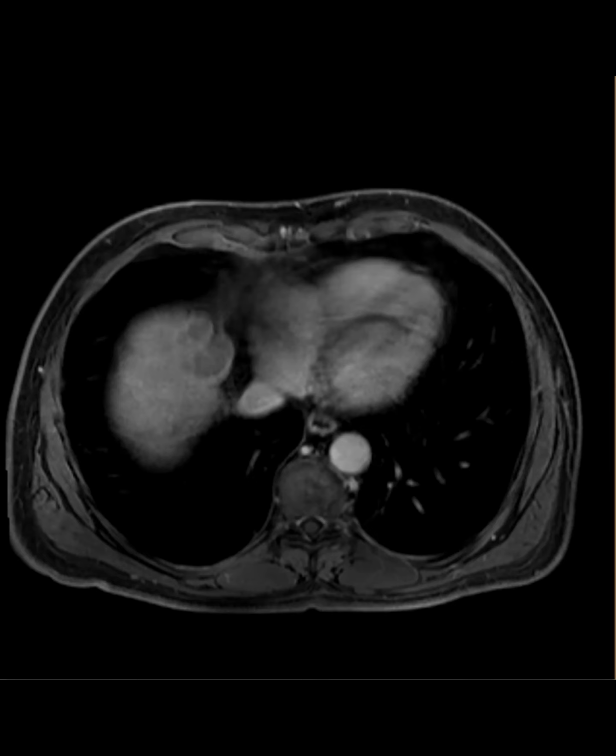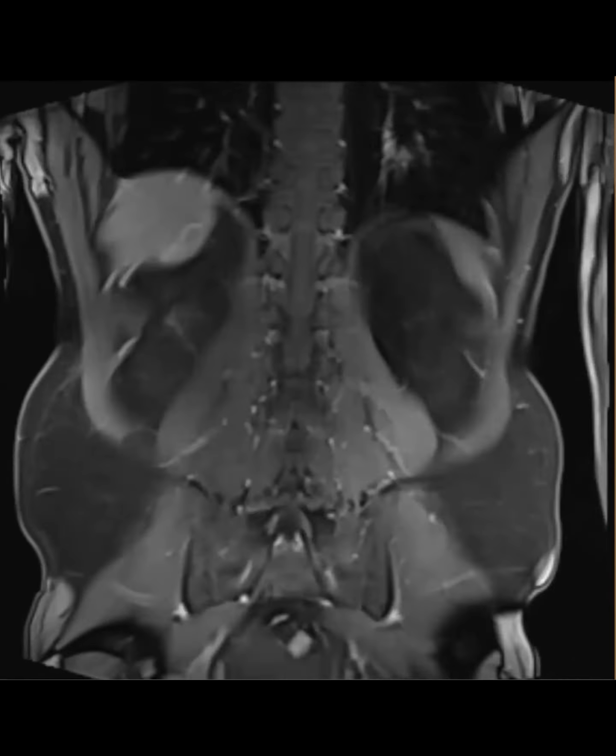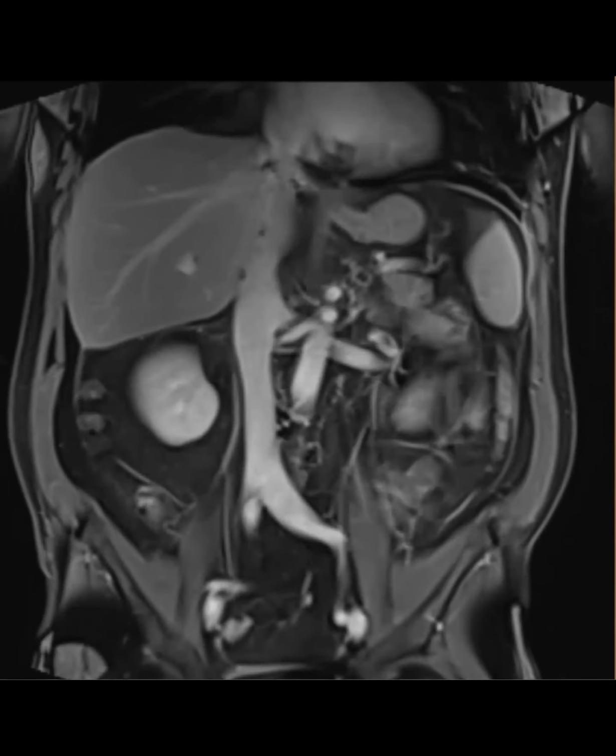Another question: Nelly, in your path report, it said there was a diaphragmatic mass and also a falciform mass. In retrospect, could you see any of that or no? That probably developed later. The patient had, I think, Y90 local regional therapy. And then this was the pre-operative, oh sorry, that's the post-explant. Let me find it.